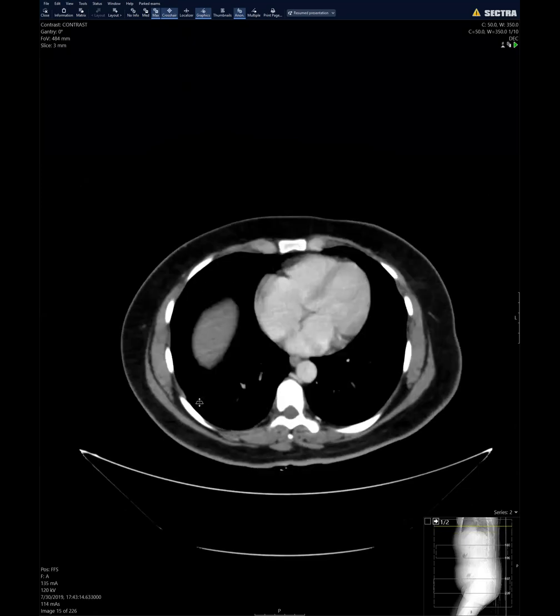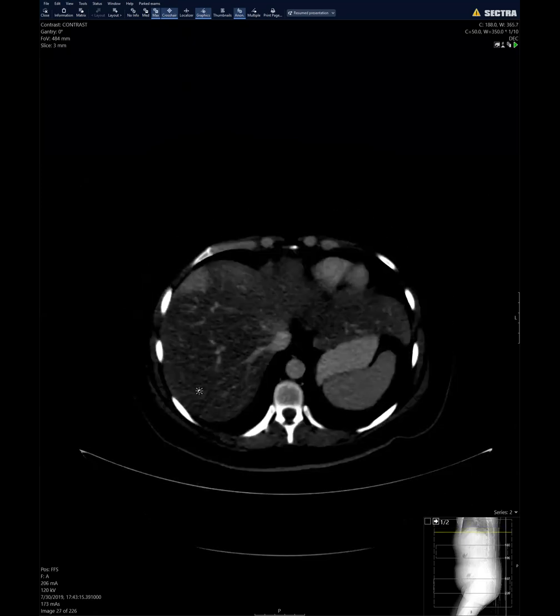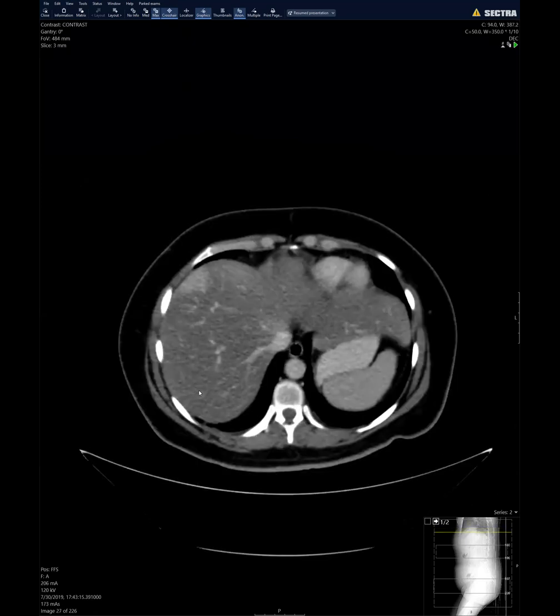Gitanjali, about your other points, I think that makes sense to me, about the focal. That was really cool that you had biopsy proof for that first case. Yeah, they really do look like masses, and with the retention of the EOVIST, I probably would have just jumped to these being FNHs. Yeah, the other thing with FNHs, that is another differential, but you always see some signal change on the 20-minute delayed. FNHs tend to take up a little bit more EOVIST than the background liver.